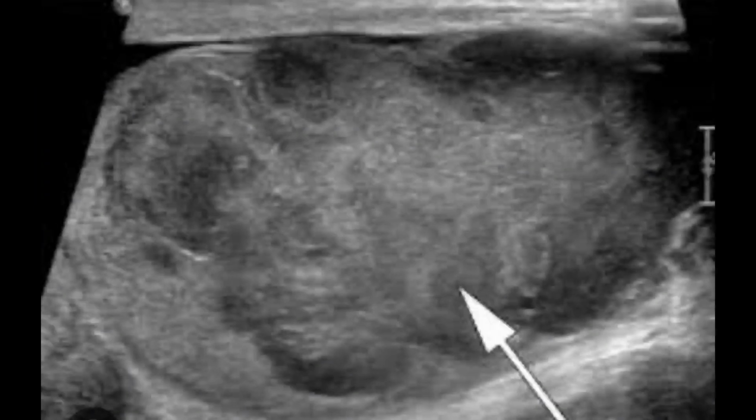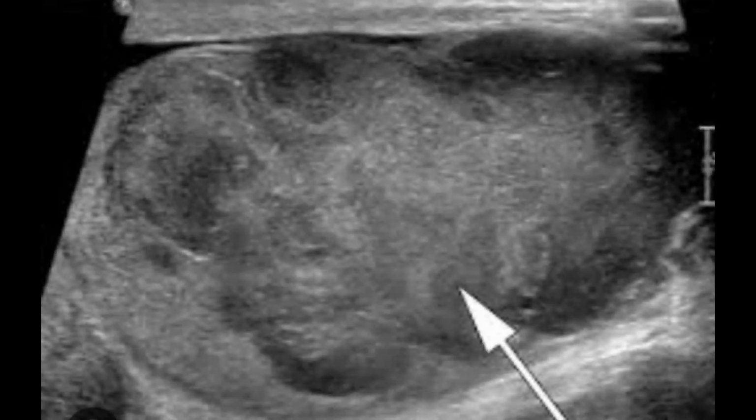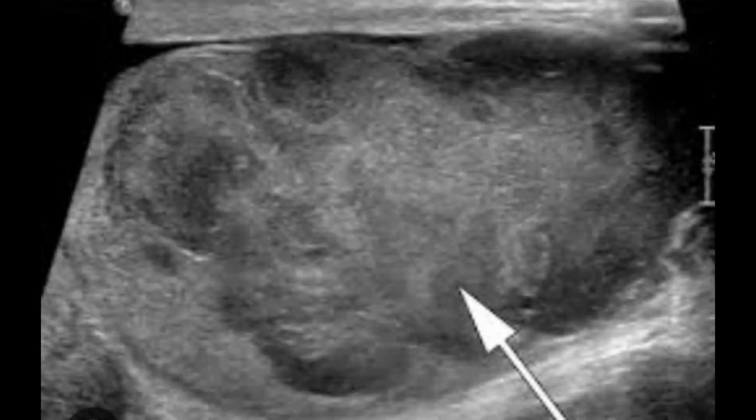Here is the image which explains beautifully multiple lobulated confluent nodules within the lesion. So this is basically what the seminoma is, and on the basis of these multiple confluent nodules, it will appear hyperechoic or heterogeneous rather. Normally it happens to be hypoechoic when there is no nodularity. When there is multiple nodularity, it will appear like that, the way you are seeing in this image, and it will appear heterogeneous. Again, I would say here another point, it will be confined to the tunica albuginea, which you can appreciate on that image.